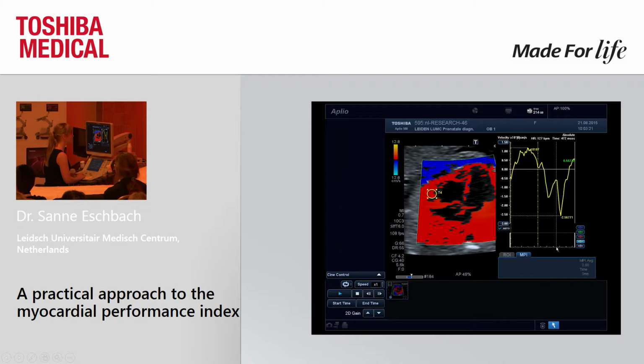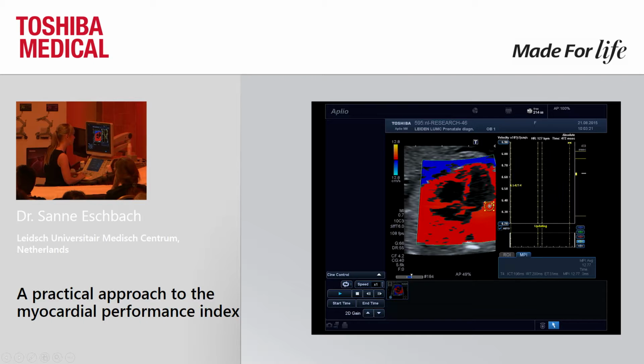So I'll show you that if you define where it stops and you move the region of interest a little bit, most of the points stay the same, and that's why the inter-observer variability is very low, because you can place it a little bit differently and still mark the same times. The left side is more difficult in our study, and that's the same with neonatological ultrasound echocardiography.